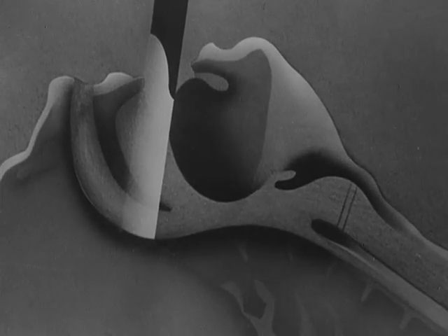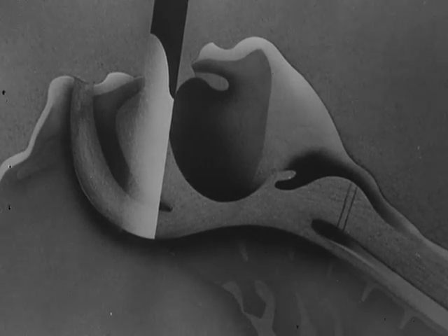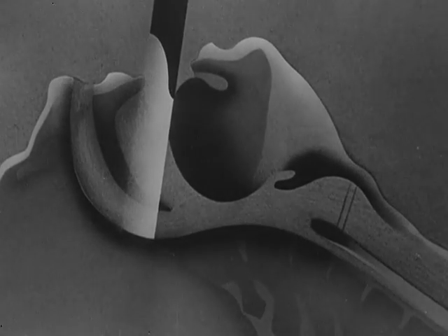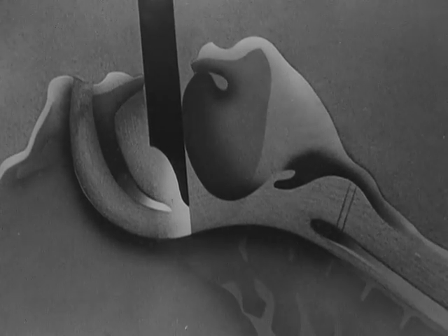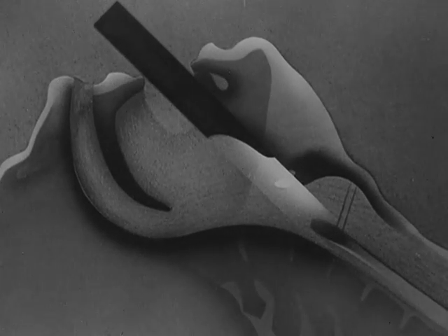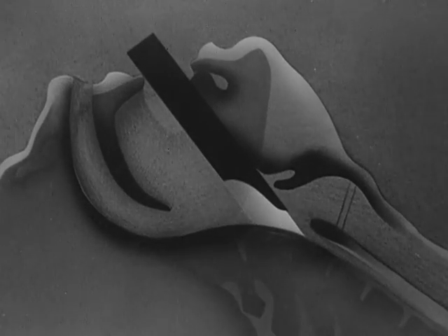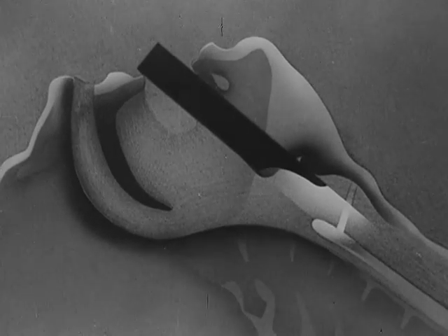First, let us see in this diagram which are the landmarks along the course of the laryngoscope. The first thing to be illuminated is the dorsum of the tongue. The laryngoscope is advanced along the tongue, and when it is advanced about half the distance it must eventually travel, the uvula comes into view. When it has reached 2/3 of the full distance, the epiglottis is seen. When this appears, the laryngoscope should be gently advanced and the epiglottis lifted and held by the tip of the instrument. Finally, the glottis and vocal cords come into view.